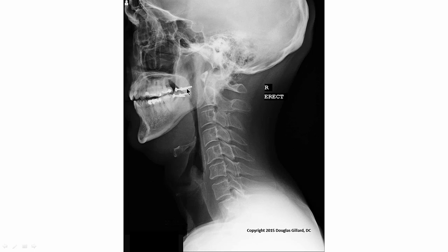This is the mandible. Okay, so this is the body of the mandible here. You can see the angle of the mandible right here, and this is the ramus of the mandible. You have the coronoid process kind of superimposed on the maxillary, or the air sinuses here. Sphenoid air sinuses are here. Maxillary air sinuses are here. So kind of hard to see that. The condylar process, the head of the condylar process fits into the condylar, or the mandibular fossa, to make up the TMJ joint. It's a real important structure right there.